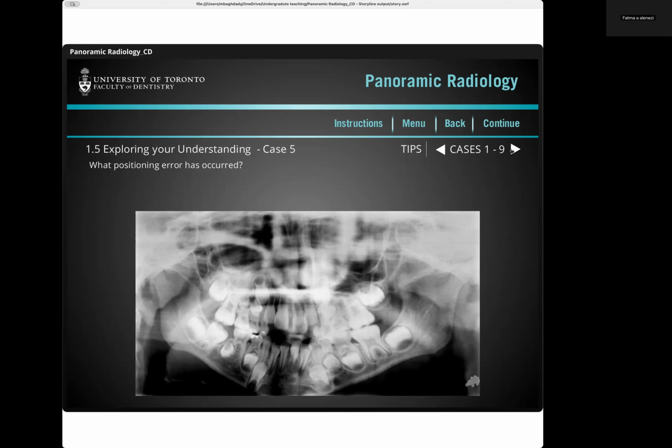So let's say the mandible is asymmetrical, okay? How do I know the asymmetry is not due to a rotational error and it's true asymmetry? How do I know the difference? Compare the picture to the patient. That's a very good thing, but it could be subtle. Let me ask you this. In a patient with true skeletal asymmetry, do you think the teeth will be affected? Yes, if the teeth look distorted. Yes, look at your teeth.